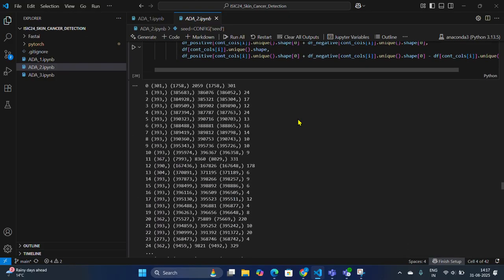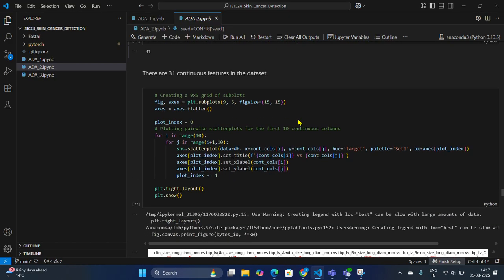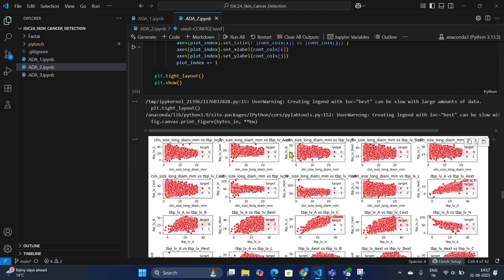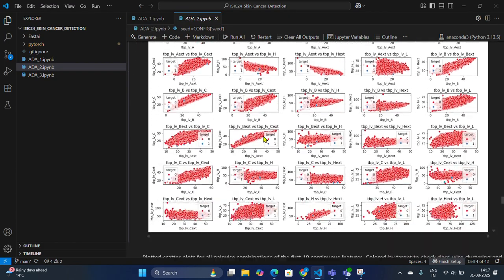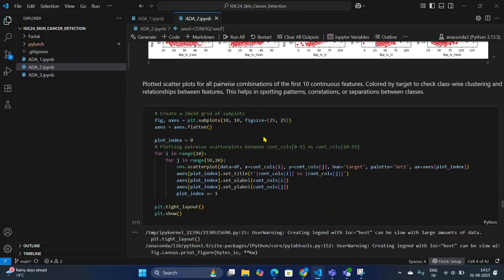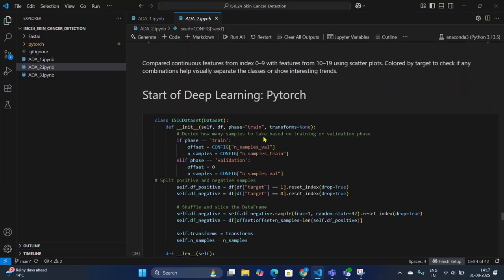I'm gonna show you the images at the end. And these are the image representations, you can see all the positive and negative, what's the height, what's the width, and what's the accuracy. You can see the area of the plot, and each and every part they are going to mention in this data set, so I am printing out all the weights and all here.